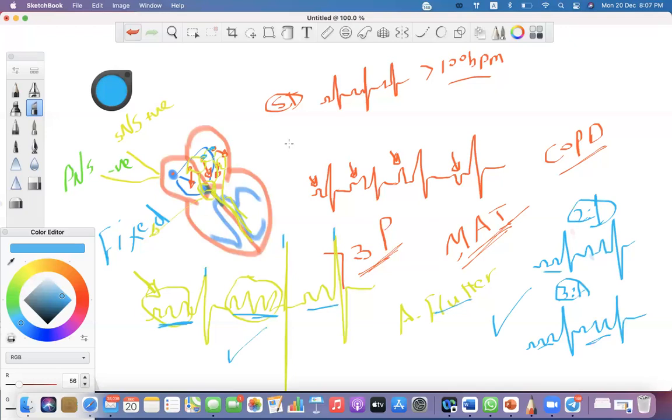So tachycardias may be due to stimulation of the SA node, causing sinus tachycardia, or may be due to the presence of multiple foci in the atria. Each one acts in a separate cycle, producing multiple shapes of P waves, causing multifocal atrial tachycardia. Maybe these multiple foci develop re-entry circuits between each other, stimulating the atrium repetitively, producing the sawtooth appearance.